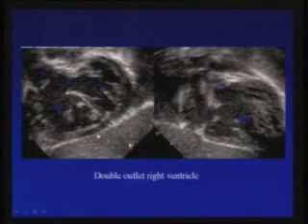Here is the double outlet right ventricle. This is left ventricle, this is right ventricle, this is aorta, and it is more than 80% committed to the right ventricle. Only outflow from the LV is this VSD. So this VSD is very important. The size of this VSD is very important to the aorta because this has to be routed in this way. This will be the only LV outflow, and may need enlargement if it is smaller. Okay, so LV to aorta we have to close in this way, which we call intracardiac routing.